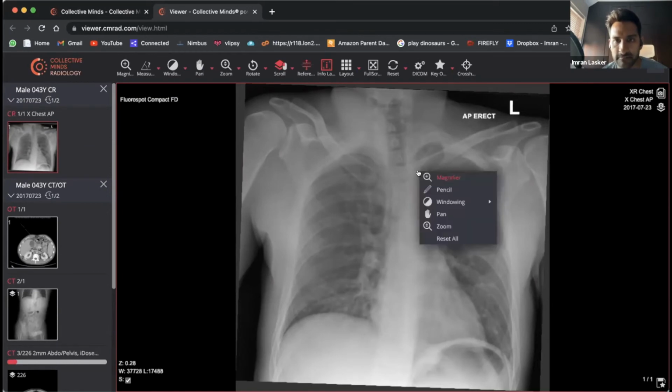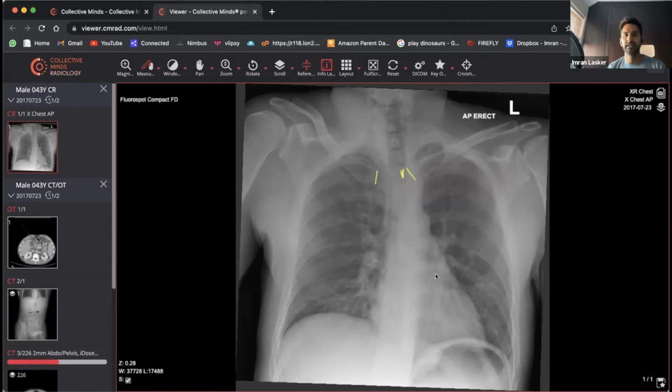Slightly rotated, because if you draw where the clavicle is there, you've got your spinous process sitting there, and that really should be in the middle, because the clavicle is the most anterior aspect of your body, the spinous process is the most posterior aspect of the body, so for them to get out of line with one another happens sooner than something that's right up next to each other.